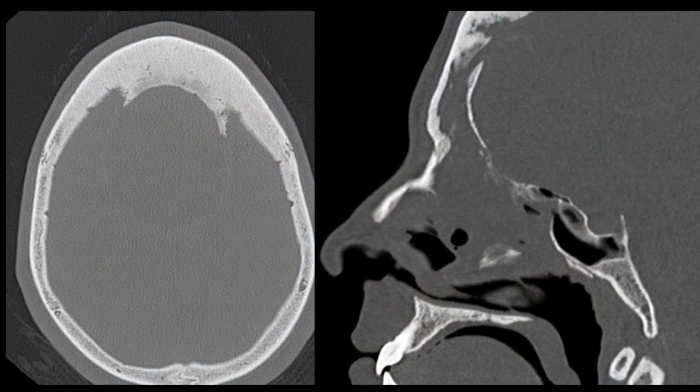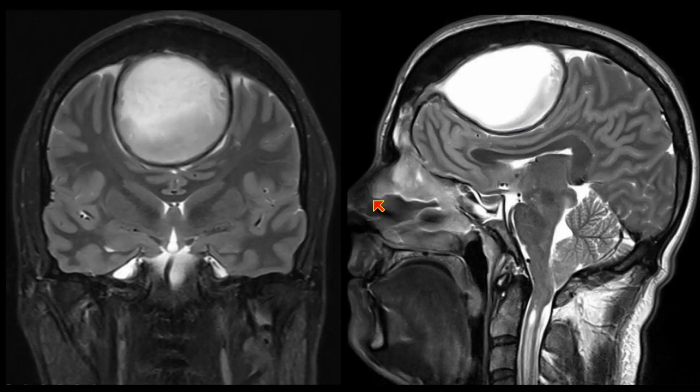This is another patient that we actually considered for sedation for the MRI we did after the CT. So initially we did this CT, and the resident read this study out as hyperostosis frontalis. So he was looking at this unusual bone formation. But it really didn't quite look normal on the CT, and it almost looked like there was a connection here with the frontal sinus. So we decided that we needed to do an MR on this patient. So we did the MR, and we actually found a giant intracranial empyema.